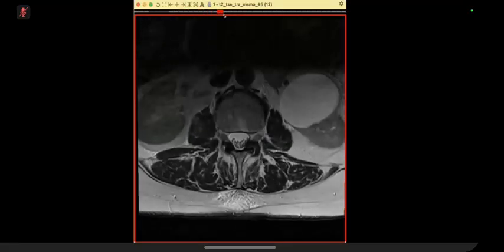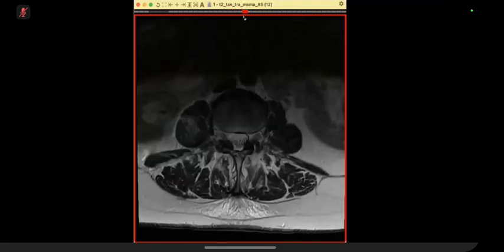What is coming to your mind? It's come to my mind that there may be some psoas muscle infection or evolving Pott's disease. What would you like to see next? I'd like to see T1 post contrast. Okay, so I am initially giving you a STIR. Over to you, doctor.